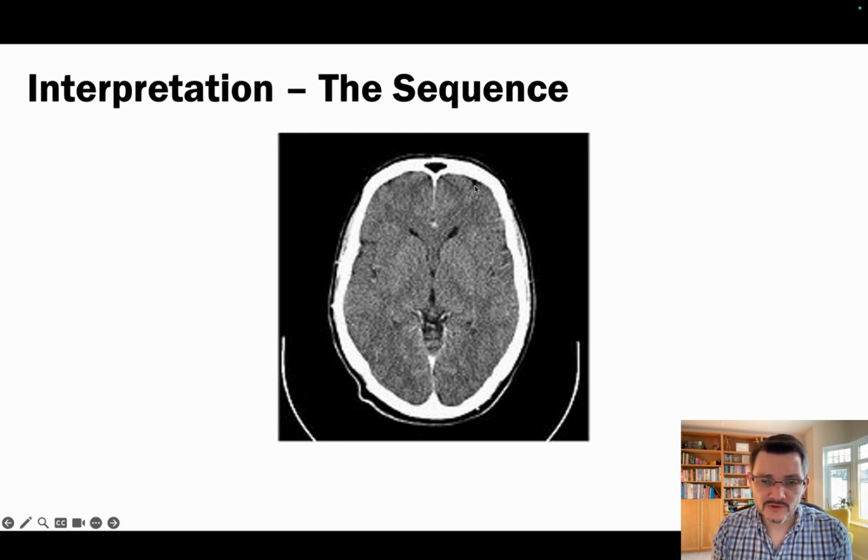You can see on this person that there's actually very little CSF space on the outside. This is quite a young person based on this. I would imagine this person is a young adult, so probably between the ages of about 20 and up to about 40, 50. You'll find that after that sort of age, the CSF space on the outside of the brain tissue will start to become a little bit more prominent as the brain tissue naturally goes through its evolution and starts to shrink slightly. By the time the person reaches about 80, you'd expect to see a good sort of 5 mils worth of CSF at the edge of the brain tissue. But at the moment, that's a healthy, fully filling brain, so that's not of any concern.